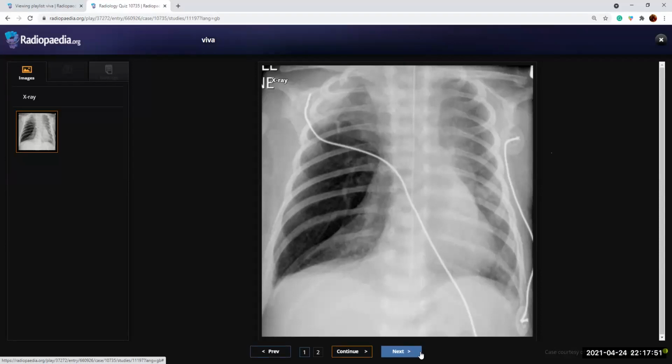What if I tell you that there was an area of opacity in the mid zone of the right lung earlier? Okay, so right middle lobe. Which part of this X-ray do you feel is pathological? I feel there's volume loss on the left side, and increased transradiancy on the right. Do you think both? No, I think there's volume loss on the left side basically.